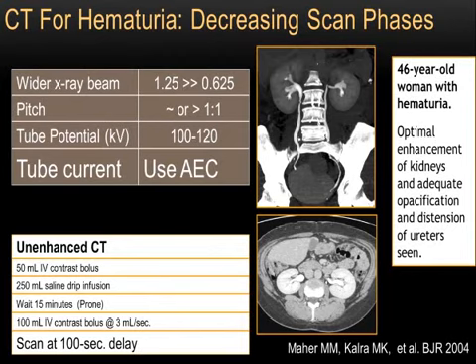And again, when you're going to do a CT urography, you have iodine on board. It's a higher contrast exam, right? So you can and should use lower dose than what you would have used for your routine abdominal CT. You would use a lower dose because remember, our yield of hematuria protocol, most of these patients anyway end up getting a negative exam, because the most common cause is urinary tract infection, which cannot be seen.